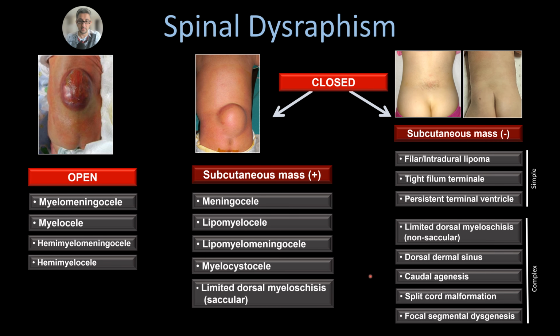So we did a comprehensive review of spinal dysraphism by showing case samples and by using this classification system. So I hope this was helpful.